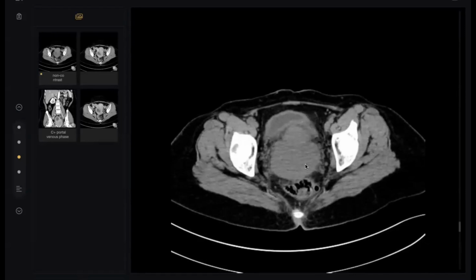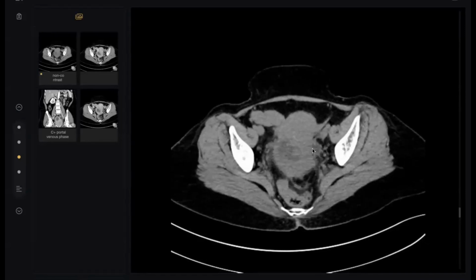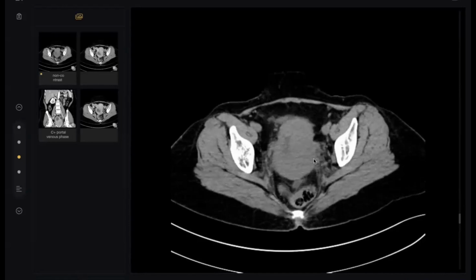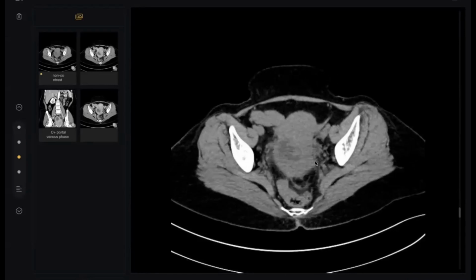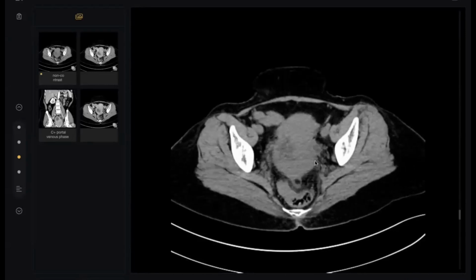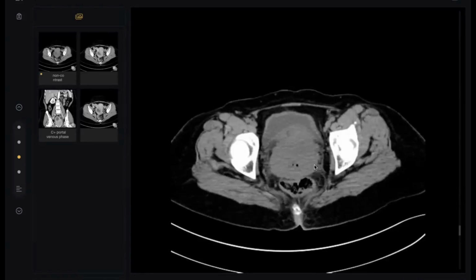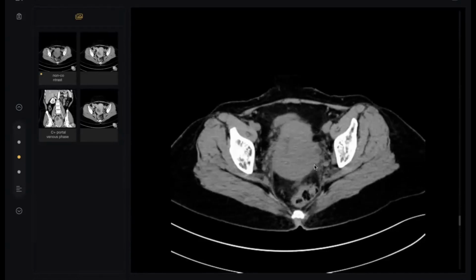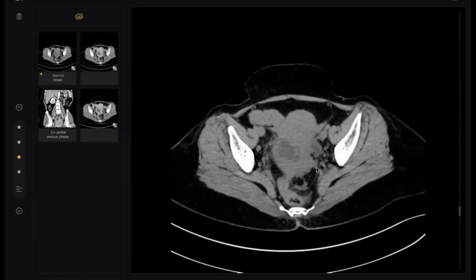So this is a uterine-based mass lesion in this relatively middle-aged lady. Initially, I'd think about uterine fibroid, which has undergone necrosis. Other differentials for this appearance would be in keeping with a uterine mass lesion. Doctor, what do you think, would a fibroid present with this necrosis and the hydronephrosis? No, it wouldn't present with this necrosis.